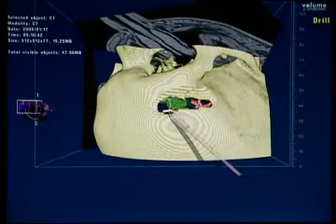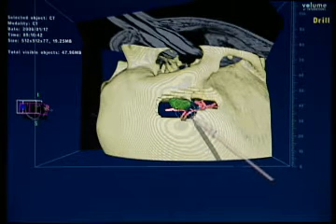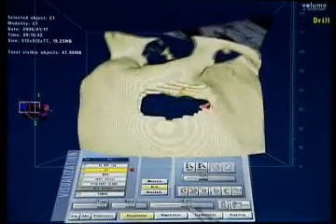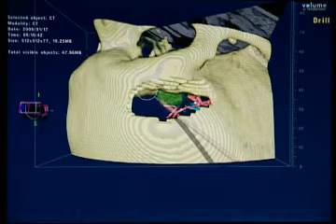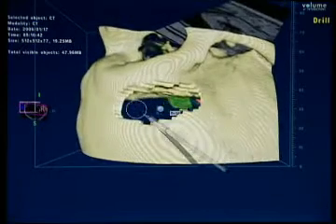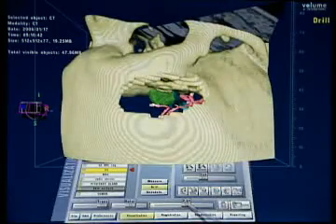So, but something like this is already pretty sufficient. It's probably even a little larger than we did it. We didn't go as temporal, but it's okay. So then you can simulate. I'll make it a little bigger. We can simulate taking the protuberances of the orbital roof away a bit. We did that while staying extradural. And then the tabula interna of the bone, we removed everywhere. Yeah. So you can already see the lesion is in the back.